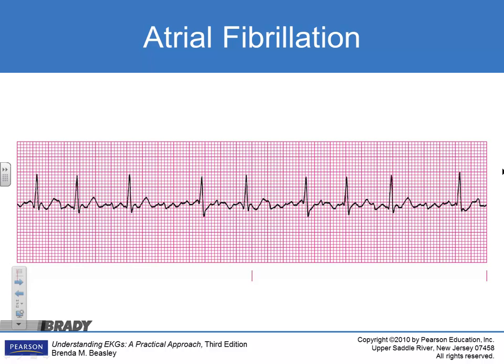So is this regular or irregular? It's actually irregular, isn't it? There's no pattern at all. If you could see couplets, is that regular? Is it regular, or is it regularly irregular, or irregularly irregular? It's irregularly irregular because there's no pattern.